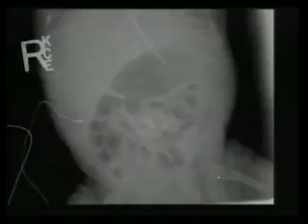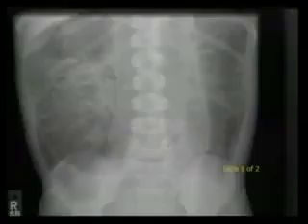Look at that. Piyush is like on fire. Piyush, good job. Don't forget to look in the groin area for inguinal hernia. There's no bowel obstruction yet, but there could be. This is an inguinal hernia, very significant. The most common cause in all people of a small bowel obstruction is an adhesion. But if there's no adhesion, then hernias are a big cause. So good job.